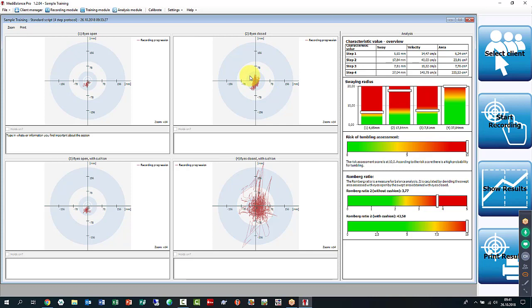You also have a zoom factor on the bottom right of each of these graphs, and here it says zoom factor is 14, which means there's not much zoom going on. With very healthy patients, you might see 60, 80, even 120 as a zoom factor. So there's so little movement that we need to zoom in a lot to actually see the graph. We didn't have to do this here because the 4th graph is so pathological.